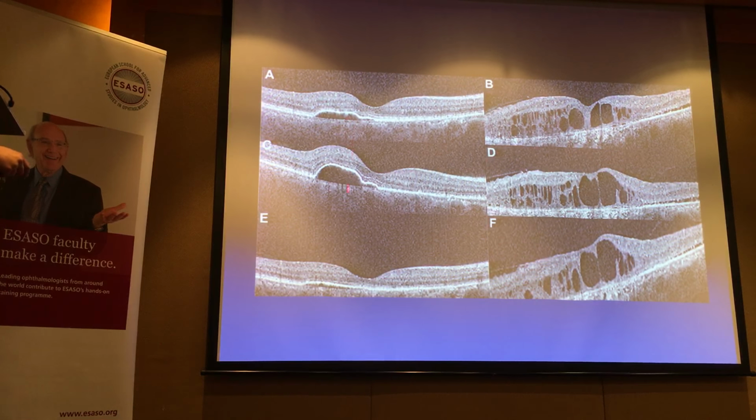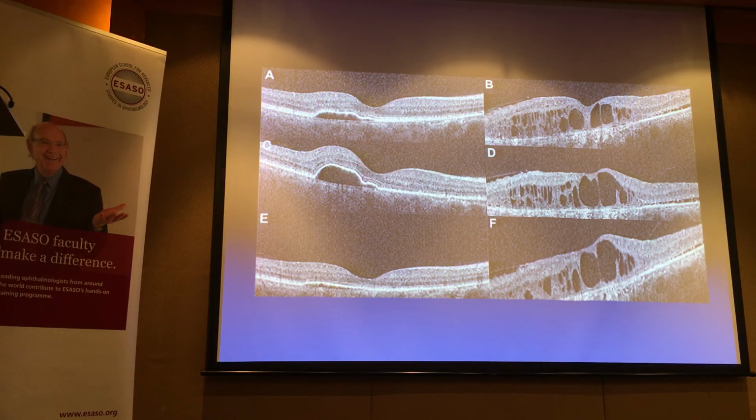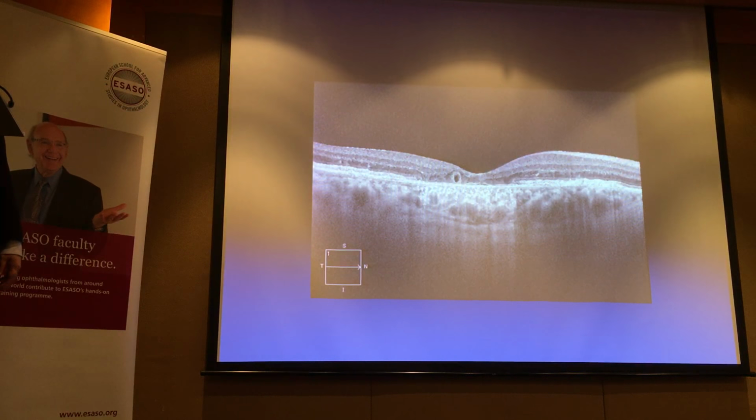This, we probably may not want to treat. This, whatever the pathology, probably some vascular thing, we will quite likely want to treat. So if you look at it, it's the same hypo-intensity, right? Doesn't necessarily, it's not equal. How about this?